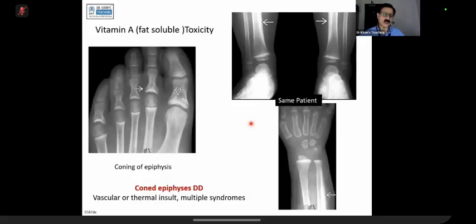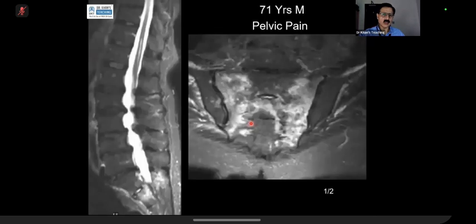Now I will just show you maybe the last case and then we will stop. Last pathology, should I say. Yes, please, candidate 4. What is this?